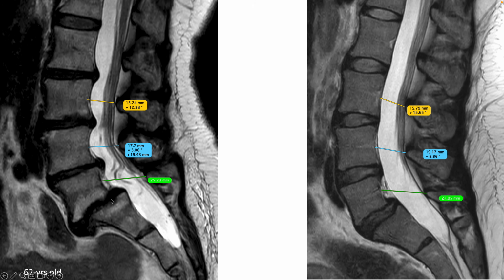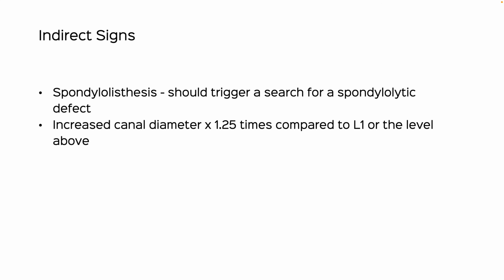And this is another patient with grade 2 spondylolisthesis because of lysis, and you can see the significant posterior displacement. So what really happens is, because there is a defect, the posterior elements are now unmoored, right? And they can move posteriorly. So if you were to actually draw a line along the spinous processes, you will see that while this line remains almost straight and curves just a little bit, suddenly there'll be a change in the curvature because the spinous process has moved backwards, and that leads to this increased spinal canal dimension. And the moment you see it, it's actually quite visual. It invariably means that there is lysis.